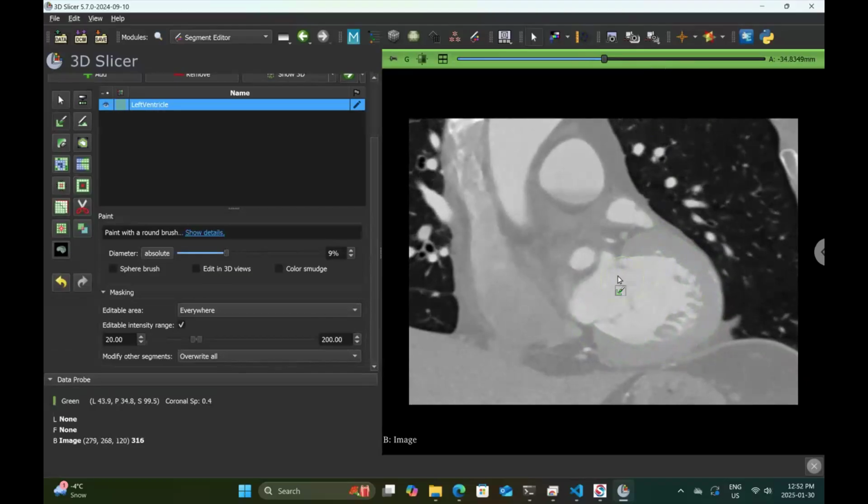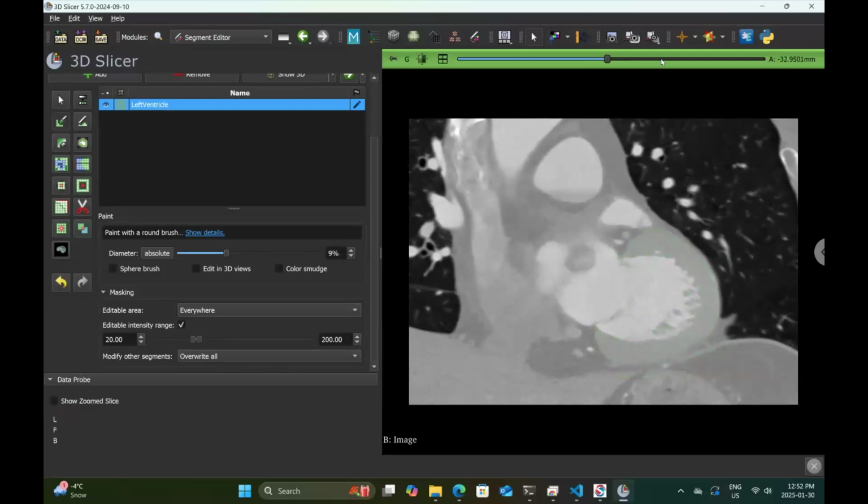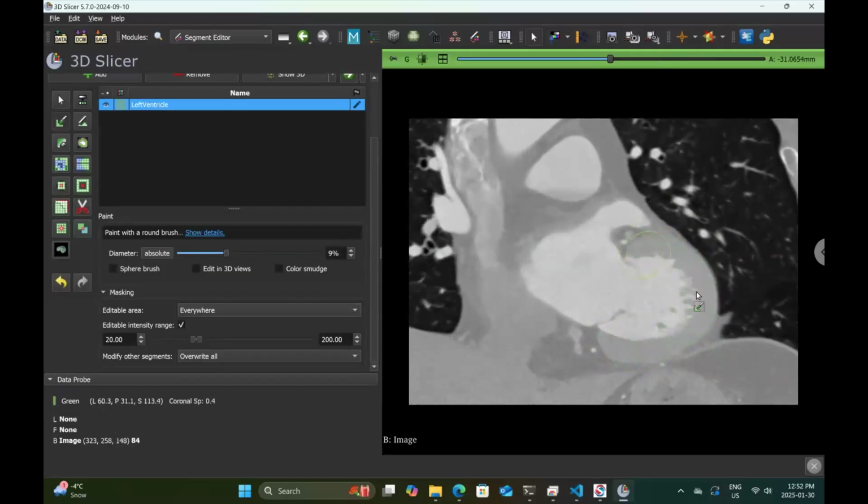So now this is basically the connection between the left atrium and the left ventricle, and you can see the valve in between them. Do you remember what was the name of this valve? The valve is open, as you can see. Come on, folks, you should all know this, taking the course.